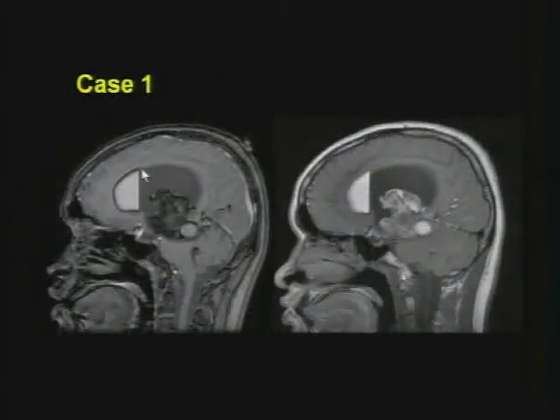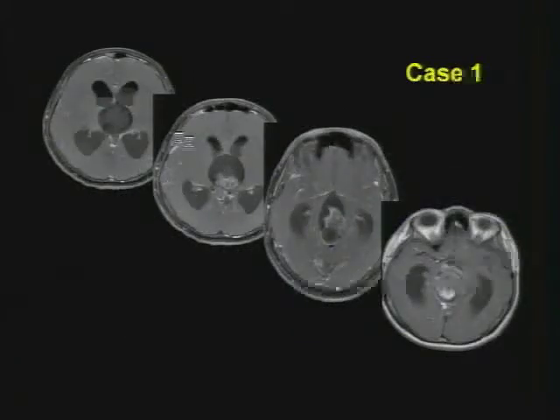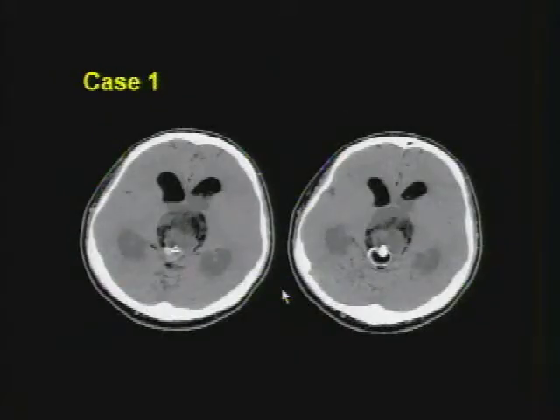And the way to prove it is, you can see nice chemical shift artifact. And actually, this is fat-saturated imaging showing you that that bright thing sats out. So fat saturation technique is a good thing to use if you're suspecting a lipid-containing lesion. So this is a ruptured dermoid, and here's a CT showing you, I don't know, it's like a rudimentary tooth or something.